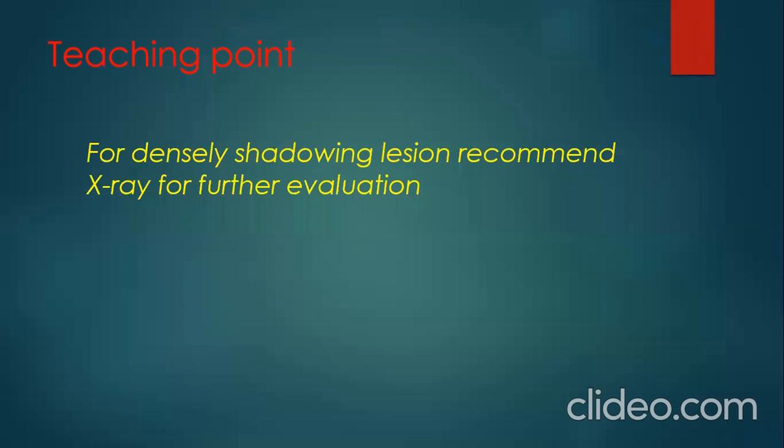So our first teaching point of the day is when you encounter densely shadowing lesions, recommend X-ray for further evaluation, because most of these are bone growths. So you can just pick them up on an X-ray. So you can just recommend an X-ray so that you see the lesion that you're dealing with.